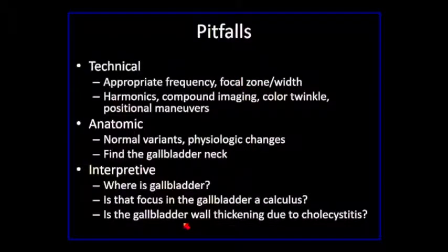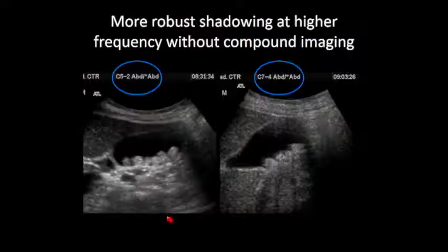Now let's turn to some pitfalls in imaging of the gallbladder, and I collect these. You know, if you are honest and work day in and day out, you will come across these kinds of problems. These fall into the technical, anatomic, and the interpretive, so everybody gets their due here. Some of these things are well known.